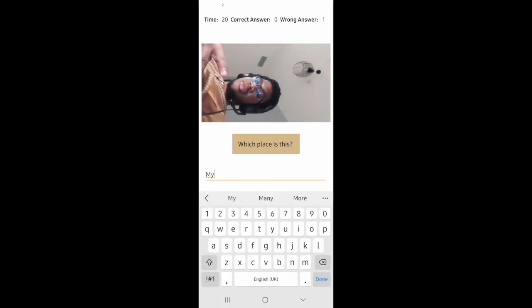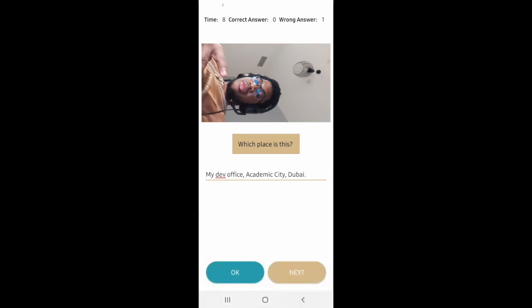This is easy. My dev office, Academic City, Dubai. Click on OK. Yes, we got the answer correct.